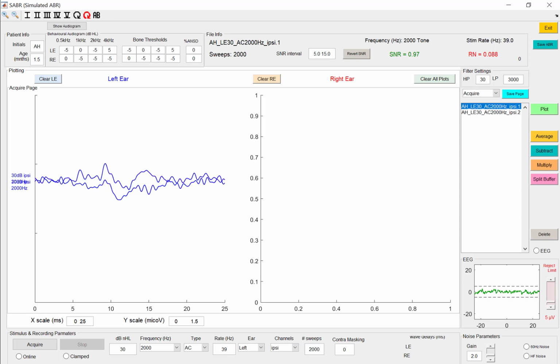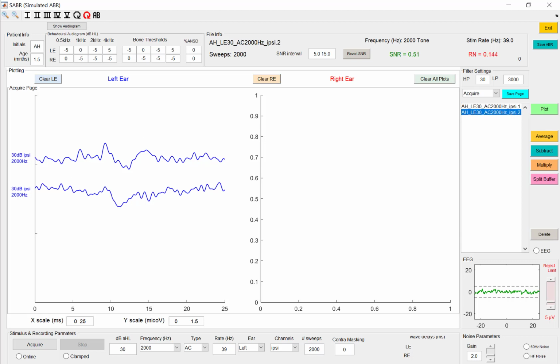The other thing you can do is if you select it, on the right, it'll highlight the file to which that waveform corresponds. If I go ahead and select this one, you can see that the waveform is associated with that file there. You can also double click on it to find out what waveform is corresponding to that, and it will briefly flash the color green.